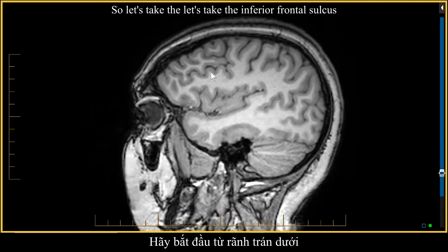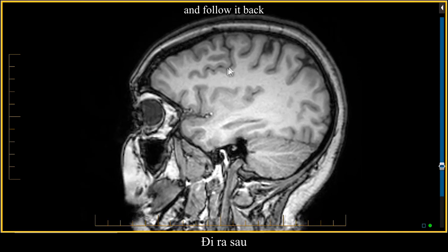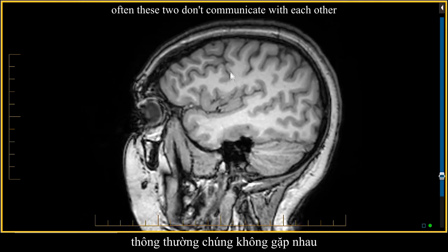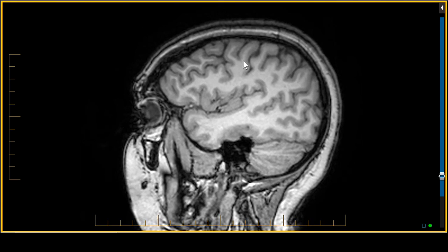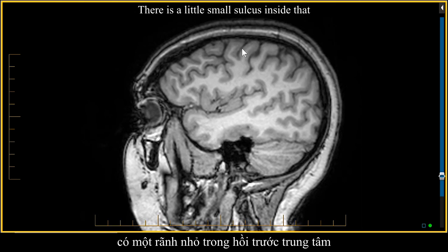So let's take the inferior frontal sulcus and follow it back. And here's this staircase descending structure. Often these two don't communicate with each other. But here you see it kind of descending like a little staircase right here. And right behind it is the precentral gyrus. So precentral sulcus, pointed to by this structure, precentral gyrus. Yes, there is a little small sulcus inside that.